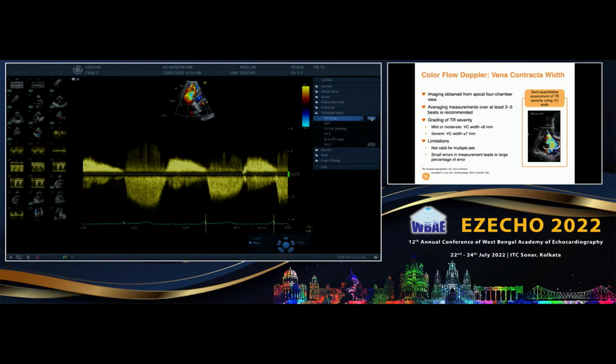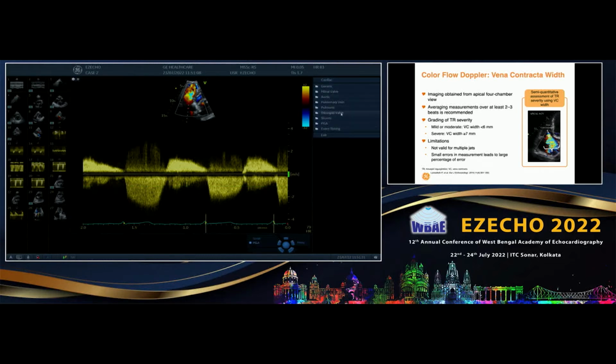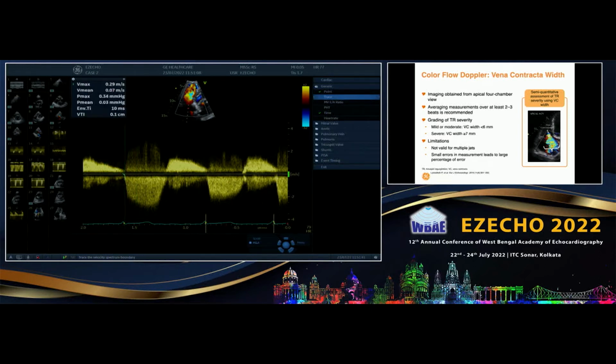And this mistake is actually much more pronounced in aortic stenosis. You get these kind of feathers like this, and people measure it here, which is absolutely wrong. Trace it. It should always be at the highest, the modal velocity outer border. Never take this feather here. You take direct trace. I think you may not take a trace also, but take the peak velocity. Peak velocity should be sufficient.